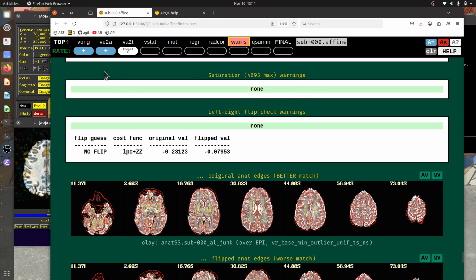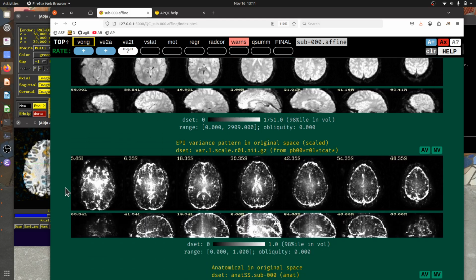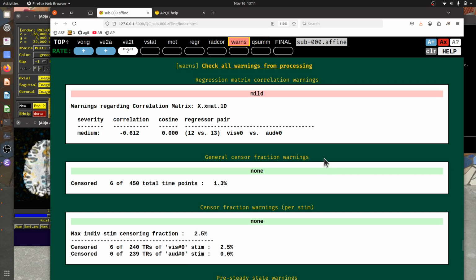And anyways, this has been a longer, deeper dive through this in detail, explaining everything. Normally, when I look at a given data set, I will go through and I will have a sense now of what I should be looking for in each case. And so hopefully this is something that you'll build up over time as you get more comfortable with these as well. So there we go. That is the warns section.